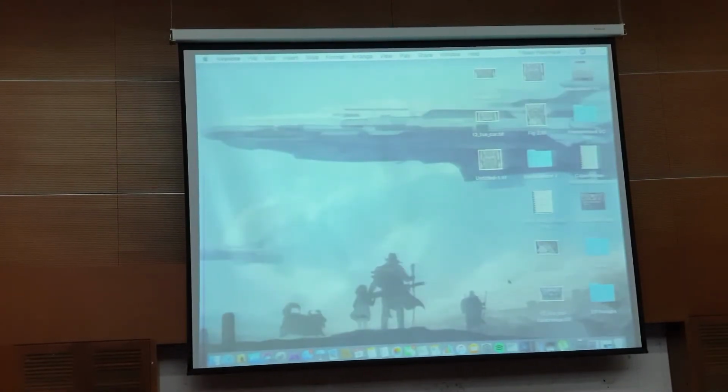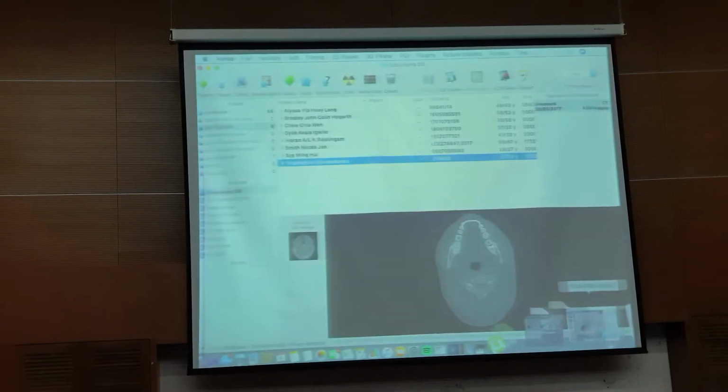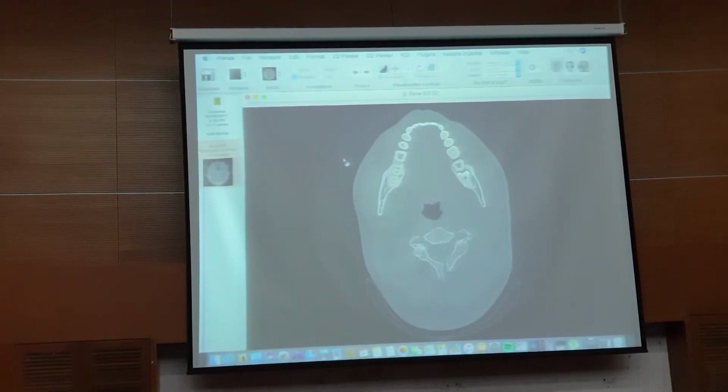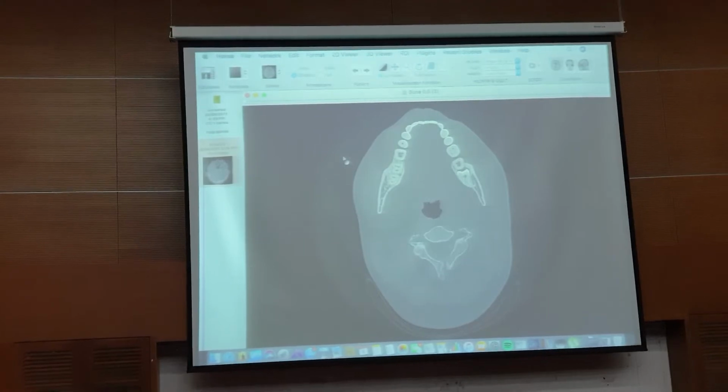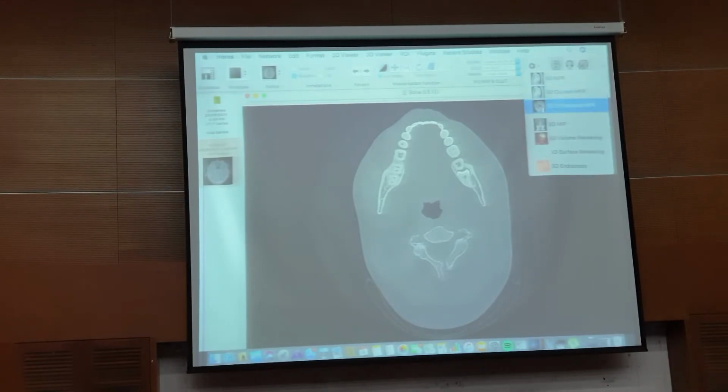Okay, for the next lecture, I'm actually going to talk about how to read a paranasal sinus, okay? So I'm going to start that by showing you a paranasal sinus CT, and I'm going to straight away tell you that this patient has a lot of things to look at. So I'm going to show it to you before the lecture, and then after the lecture also I'll show it to you again, and we'll see whether you see anything extra at the end of the lecture, which would mean that my lecture is either very bad or very good. Okay, so we'll start with this patient.